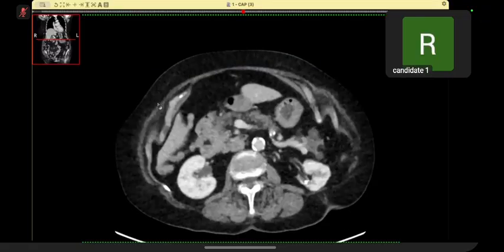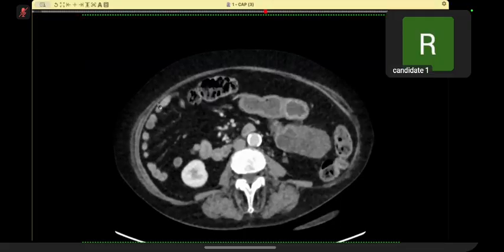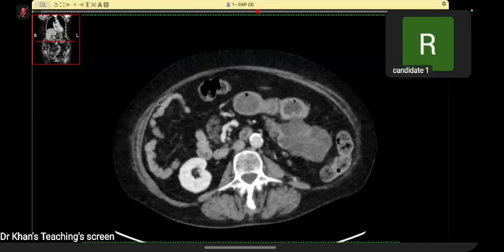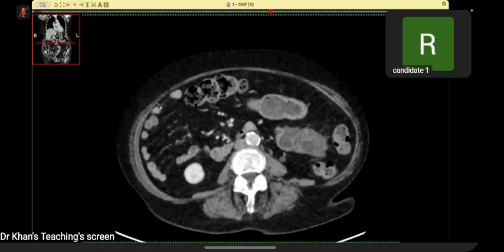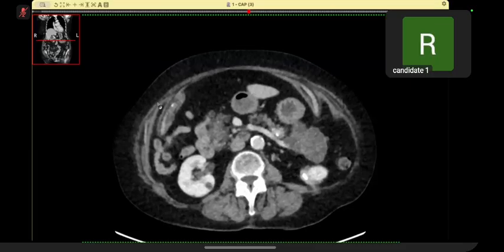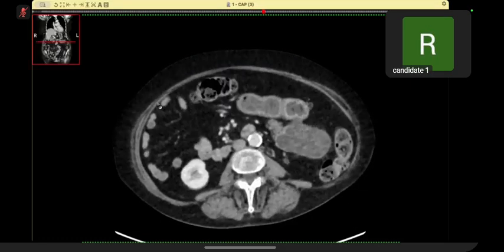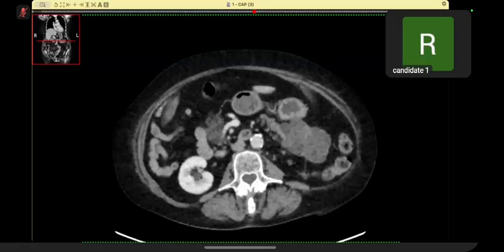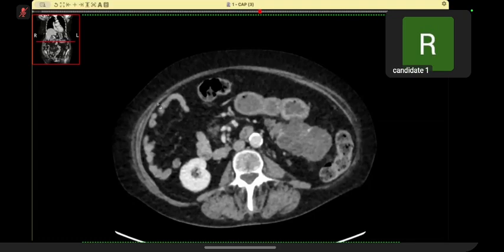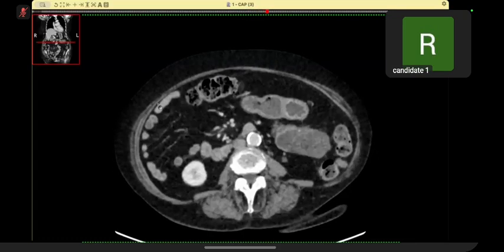Sir, can you again go to the main? I do not see any vascular thrombosis. I see some specks of calcification in tiny cystic areas within this lesion. So, in summary, this is a cystic pancreatic neoplastic lesion, likely serous cystadenoma of the pancreas. It is closely abutting the anteriorly placed bowel, in close approximation to the bowel. However, I do not see any fistulation. The fat planes with the bowel anteriorly are blurred.